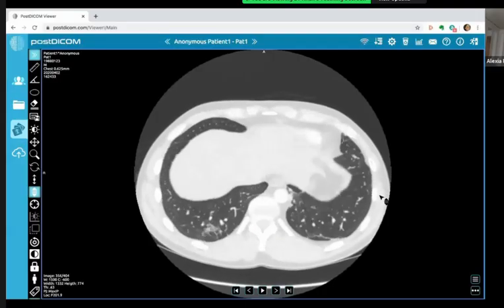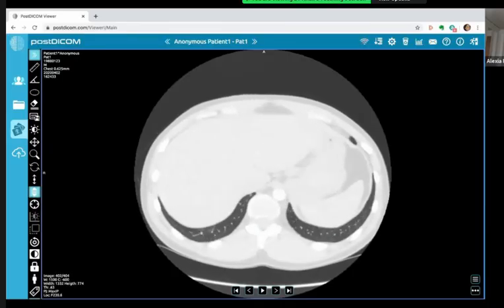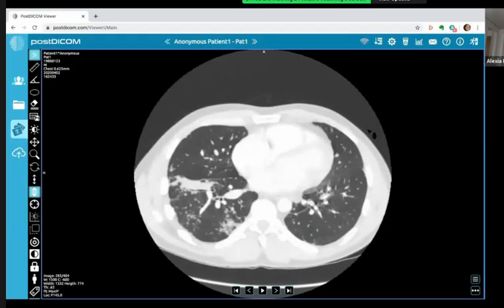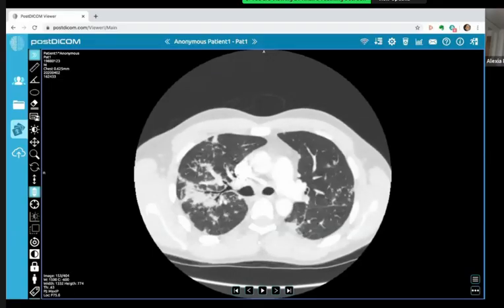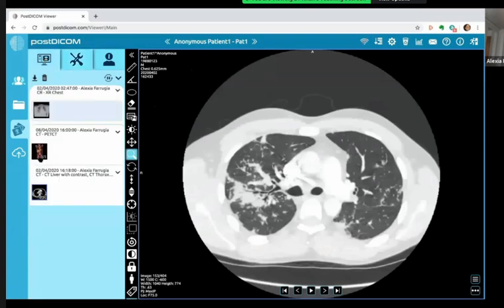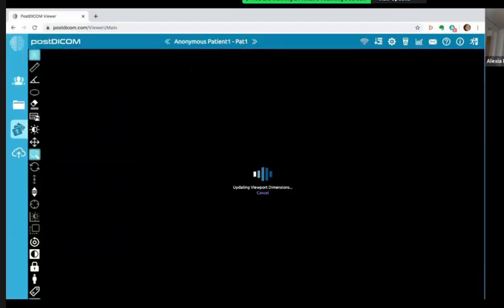Great. So he's 32. Then he started losing some weight as well, and they decided to go for a PET. They were worried about a malignancy. I agree with your description and with your differentials.